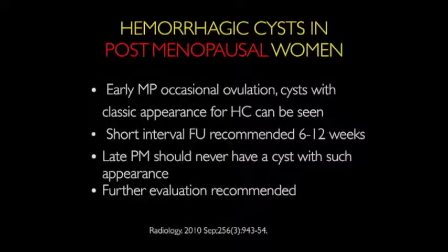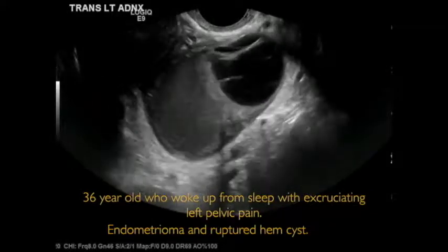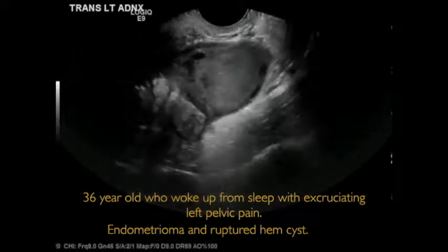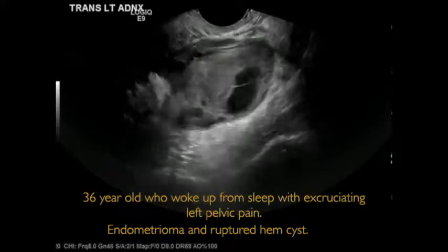Now, what is very important, though, if you see something in a postmenopausal patient, and because you can see hemorrhagic cyst in perimenopausal patients, because they can occasionally ovulate, those you should definitely follow up short term, such as 6 to 12 weeks, to make sure that this is not a mass or something that would mimic something else. So here is an example of a 36-year-old who woke up from sleep with, see the cine is not playing, excruciating left pelvic pain. In this case, you could see there's an endometrioma and a normal paired ovary otherwise, and also a hemorrhagic cyst. Not a lot of free fluid, but clearly her pain is due to the hemorrhagic cyst.